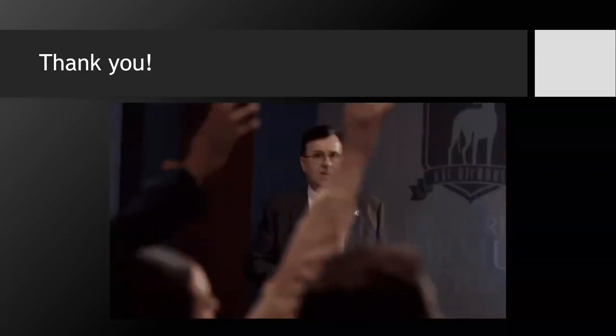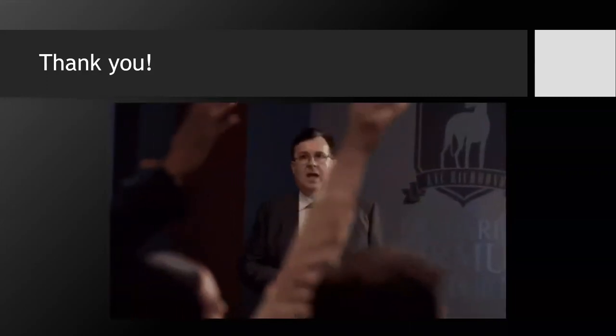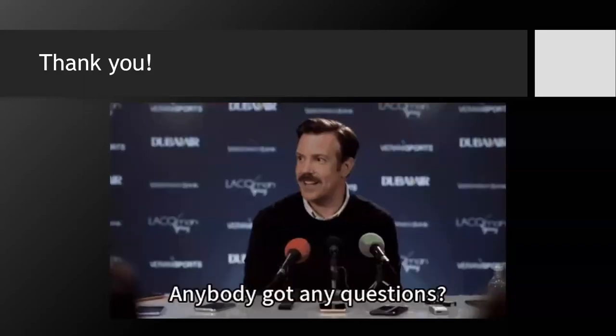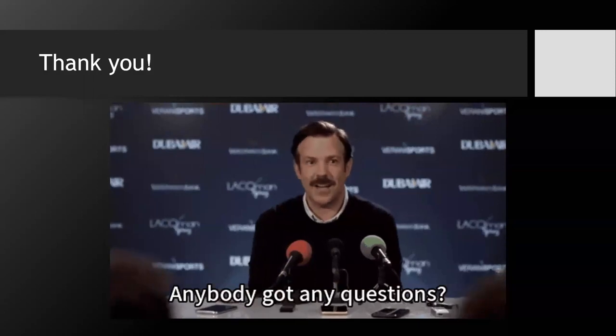It's pretty hard sometimes to get an apical 3-chamber view, but I would assume that if we're calling the LVOT diameter circular, then it really shouldn't matter which angle we're getting the flow through. So I guess if we're intellectually honest, then it should be the same. But yeah, I haven't seen it done like that, but that's interesting.